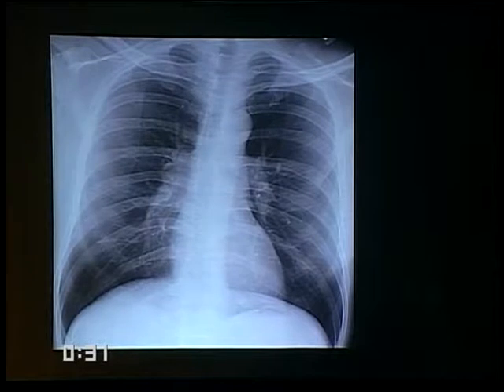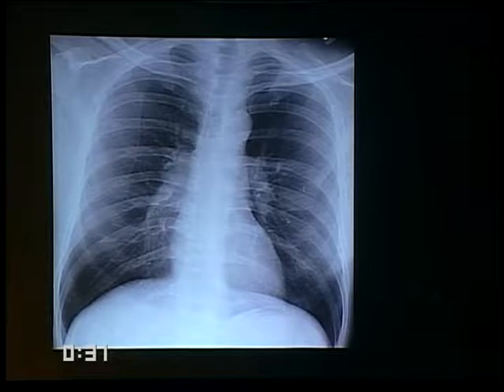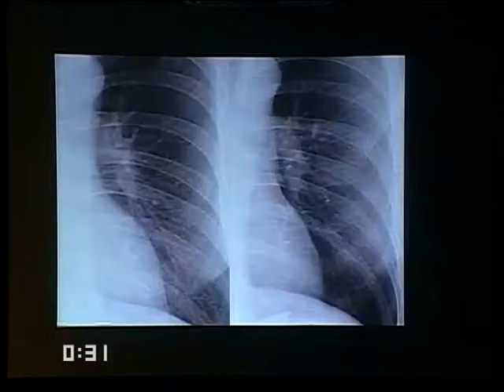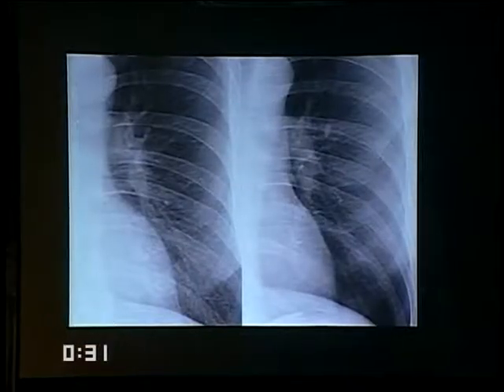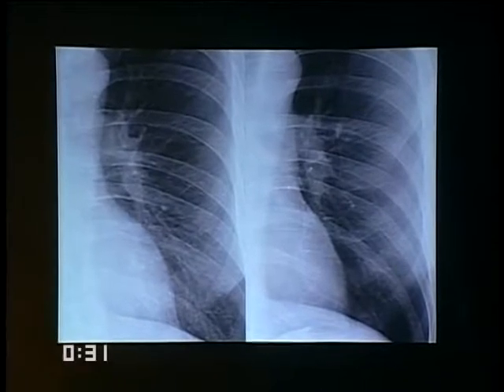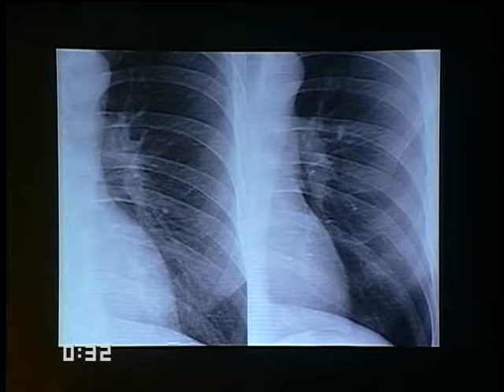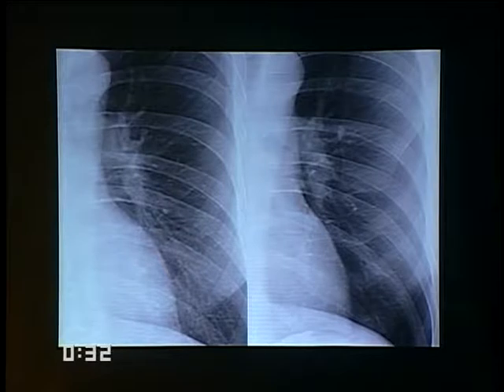If you look closely at the left hilum, it looks a little strange, and we'll come back to why it looks strange. It's not perhaps particularly large. It's a little sharply defined, and perfusion in that left lung looks decreased compared to the right lung. Here was a previous chest radiograph that shows a relatively normal-looking left hilum, and here they are side by side. So the overall size of that descending pulmonary artery has increased, and it's rather sharply defined with an area distally that has decreased perfusion. So although that's not specific and the chronicity is difficult to tell, that should raise our level of suspicion.